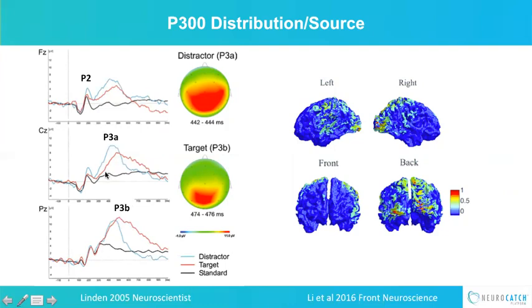And in this experiment, what they can show is that when you look at the P300, it has a broad distribution across the scalp. You can see all this red activity showing you the peak of the P300. And when you look at different variants, this P3A versus this P3B, all of a sudden you can notice that while they're distributed generally in the same area, the distribution, the shape of the peak on your scalp, is different. And this is much more of a sharp peak in terms of your scalp.